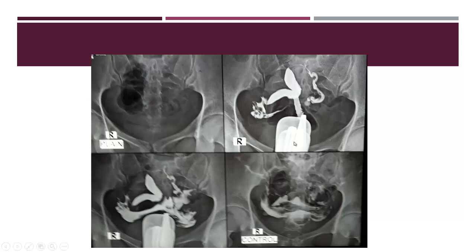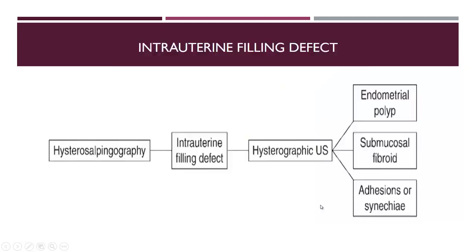Another case, duplicated uterine cavity, and these are the normal fallopian tubes. So this is a subseptate uterus, but better to say duplicated cavity for ultrasound. Then we came to the end, from the contour irregularity, we just missed the adenomyosis. We will see a slide for adenomyosis later on.